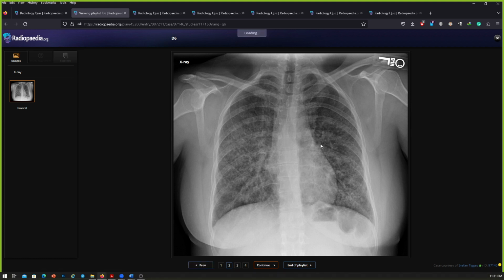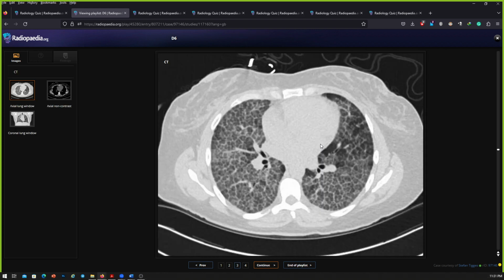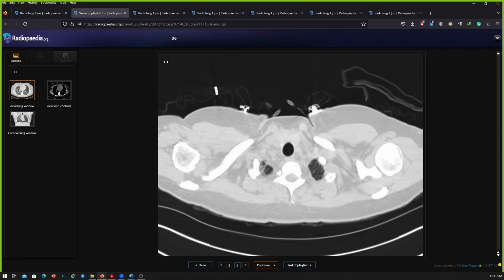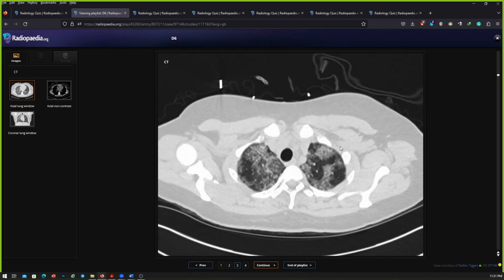Okay, have a look at the CT of this patient. I will give you the control, and then you can start scrolling. I have given you the control. You can accept it and then start scrolling. You can scroll the mouse. Yeah, go ahead.